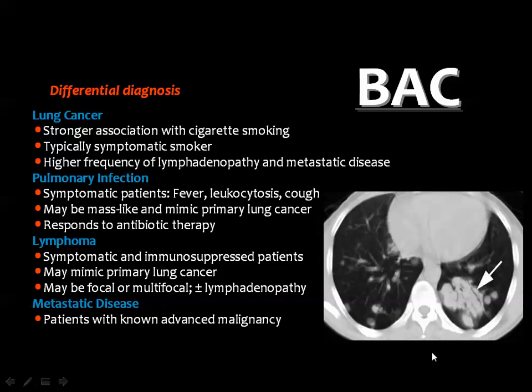But in the presence of these nodules, the issue of round pneumonia is not here, and number one you think of bronchoalveolar carcinoma, because you know that it starts with miliary shadows, which coalesce to form larger shadows, then coalesce to form patches with internal air bronchogram. This is a very important appearance to lead you to think of bronchoalveolar carcinoma.